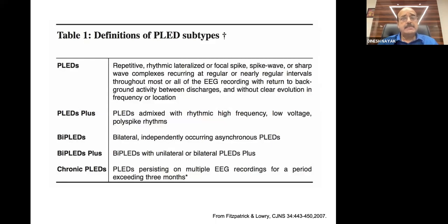Now, what is this PLEDs plus? PLEDs plus is nothing but after every discharge, there are rhythmic polyspike rhythms. That means there are some fast or rhythmic discharges, RD. That's what is called PLEDs with RD, or rhythmic after-discharges. That has a very high connotation with seizure.